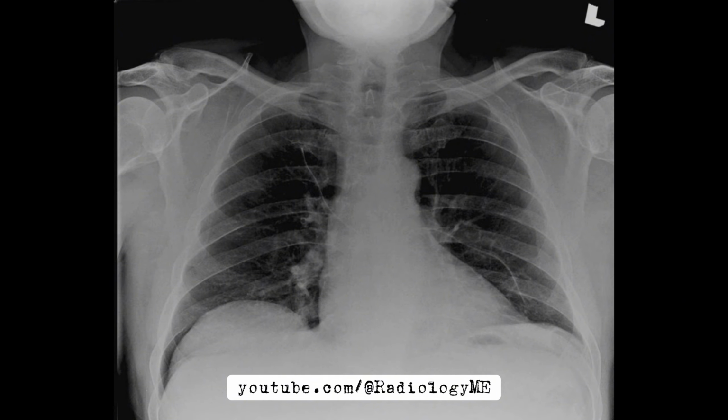line embolization. Line embolization happens when the catheter breaks or gets damaged somehow, and a fragment of it migrates to the lungs. The line piece is usually picked up on chest x-rays, and like we saw in this case, we can see the embolized fragment tracking through the pulmonary arteries. This is something you don't want to miss because it can lead to significant morbidity if it's not addressed quickly.